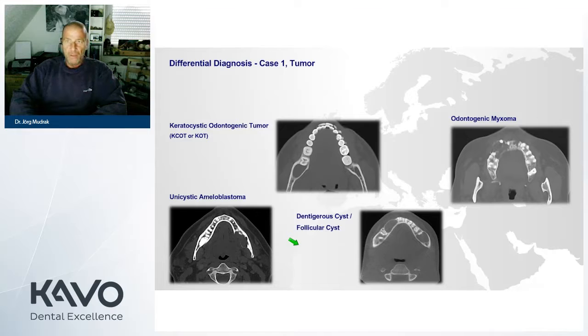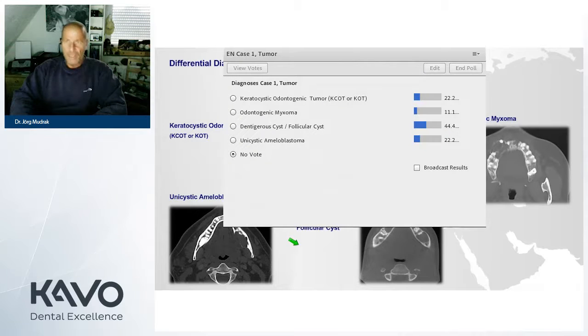Remember all the single facts that we have listed, so that means we have a kind of table which does hint to some kind of diagnosis, and I see the variety is very large. That is very good. So it means you are really thinking about that. Very good. So you still have now 10, 9, 8, 7, 6, 5, 3, 2, 1. Okay, let's close now. This is a very interesting result. And now let's see what the diagnosis of this case has been.